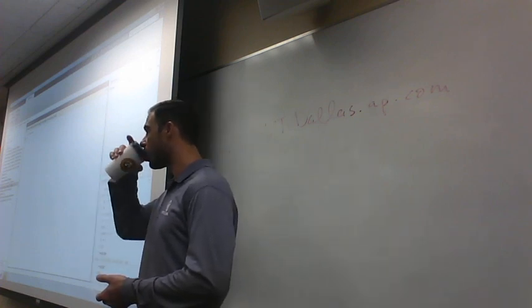Uh-oh. Let's take a look. Clear and CLC are different commands, so you should not do that. Clear all should be clear all. Okay, you just type CLC. Just do that. Okay, that's fine. Just type in CLC.